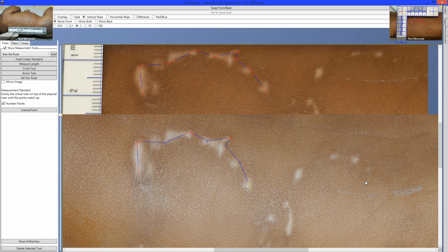Right, like, let's bring it right about there. And that actually looks like a fairly reasonable match. Move this down a little bit like that.